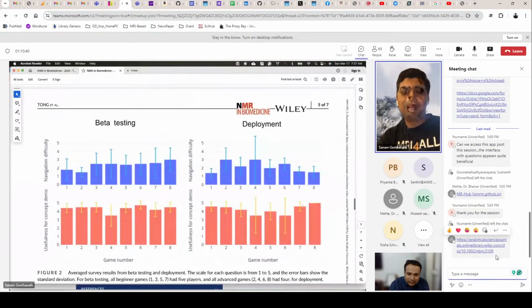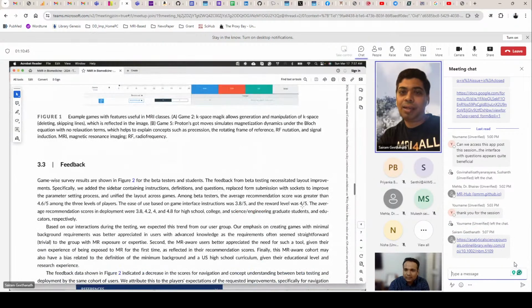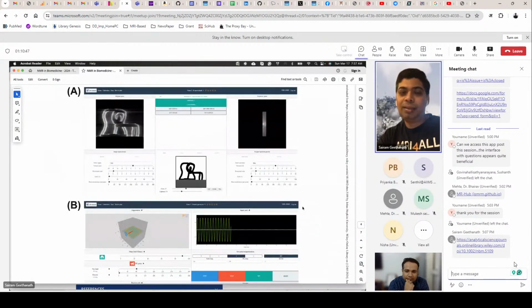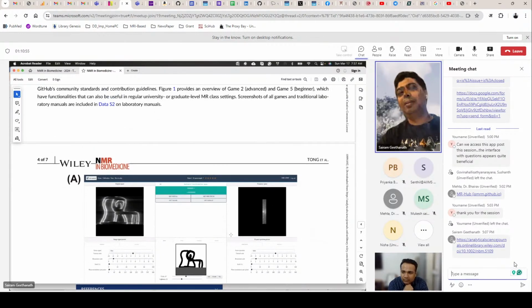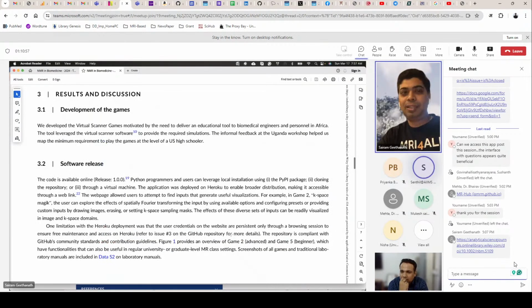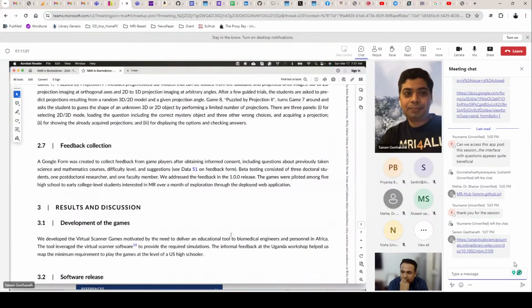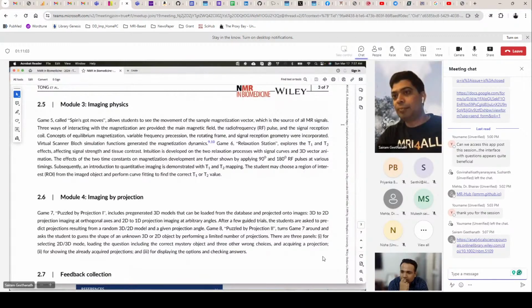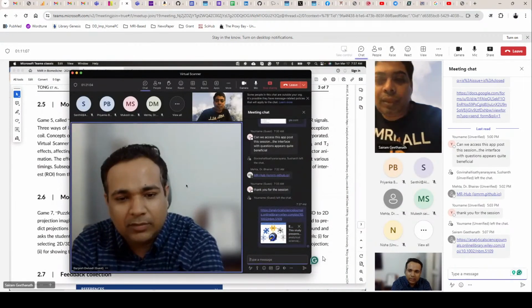If they can earn the stars, they are able to demonstrate the definitions. So here this is going on laboratory frame, and we saw a bunch of examples of this. But you could use this even independently, with or without a classroom setting. I think it's very useful from the teaching point of view and from the students' point of view as well.